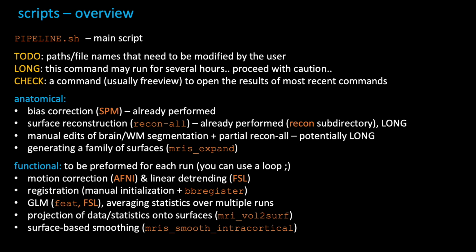TODO tags mean that you should make sure that the path or the file name is provided, and it actually refers to your file structure or to the location of FreeSurfer on our server. So that's just providing the input information.